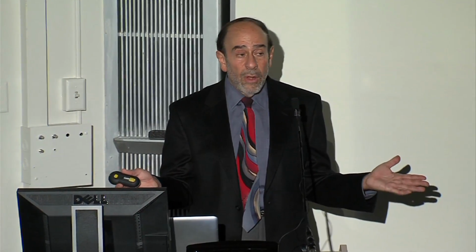Now I'm editing. I dictate, I see it on a screen, I'll show you this in a minute, and the report goes right out, and it can be viewed anywhere. And we can also look at images anywhere. We can transmit them, instead of just seeing them where the film library is, and come in and look at a film, we can take those images and send them to the operating room, send them to the clinic, send them to another facility. Here at UCSF, we're all over the city, but it doesn't matter. It's like we're all in one place.